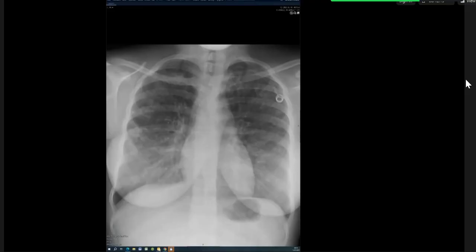In summary, this is a patient who has a portocath with bilateral cystic bronchiectasis and a focal opacity in the right mid-zone peripherally, and a suspected further opacity in the right lower zone. I would think about cystic fibrosis in the first instance, and with the cavitating opacity, I would be worried about atypical infections.